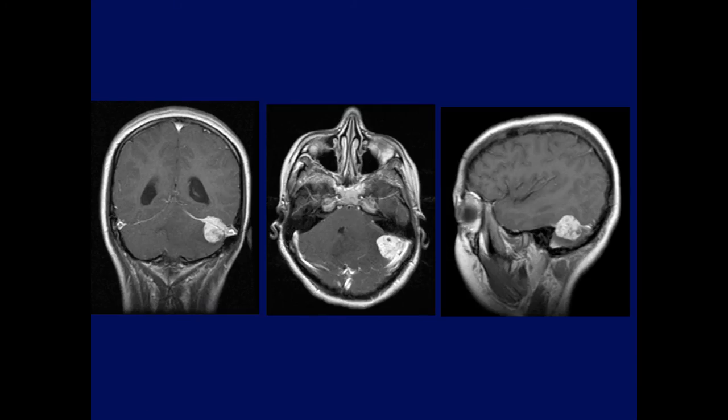Okay, what about this meningioma that I myself read as a classic meningioma involving the tentorium? Anybody want to agree or maybe bring up another diagnosis? Well, I was surprised. This was a cavernoma at surgery, not a meningioma. Sure looks like a classic meningioma.